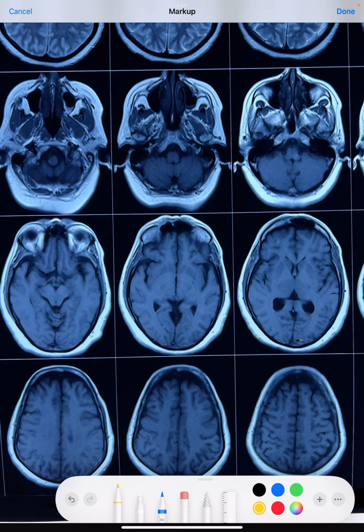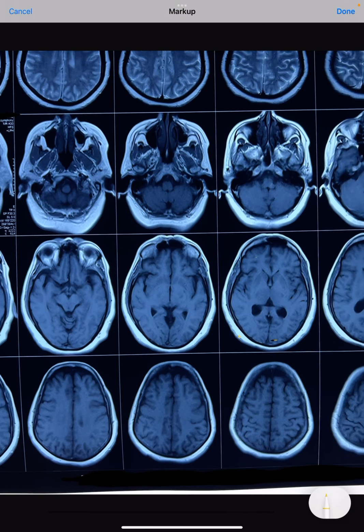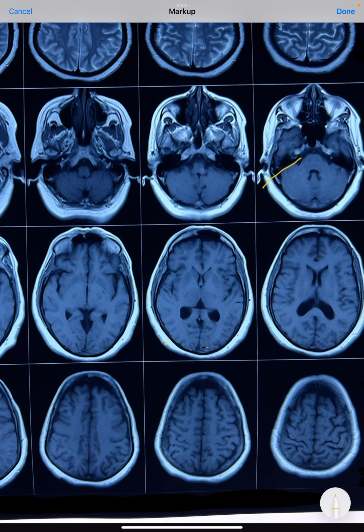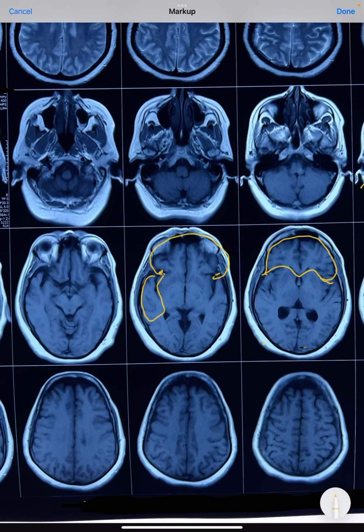The other lobes which are there are the frontal lobe, which is very, very important. As I told, this is the posterior fossa, this is the middle fossa you can see here, and this is the anterior cranial fossa. In the anterior cranial fossa, you can very easily see that we have the frontal lobe. So this is all frontal lobe. We can very easily make it out here. See, this is the dimple, and above this dimple is all frontal lobe. Posterior to the dimple, this is all temporal lobe. We can see this is the temporal fossa.